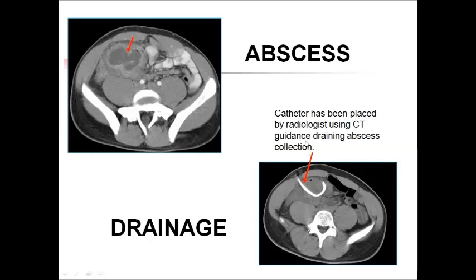For example, here catheter has been placed by radiology using CT guidance, in order to drain abscess and collection of fluid from this abscess, not fluid, pus.